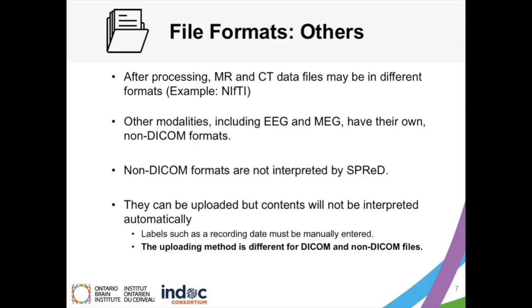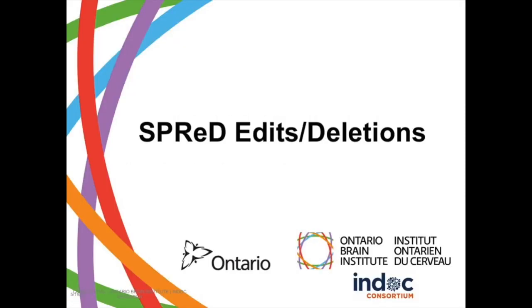Other file formats within SPReD. After processing, MR and CT data files may be in different formats, for example, NIfTI. Other modalities, including EEG and MEG, have their own non-DICOM formats. These non-DICOM formats are not interpreted by SPReD. They can be uploaded, however, their contents will not automatically be interpreted. Labels such as recording date must be manually entered. The uploading method is different for DICOM and non-DICOM files.